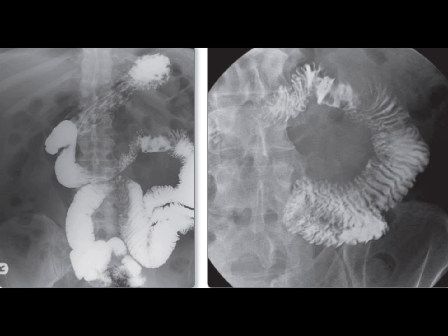The bowel lumen appears to be slightly reduced, but there's no tight stricture, and there's no dilatation of the upstream segments of the duodenum, ruling out obstruction. Even though the lesion appears solitary, I would meticulously examine the rest of the barium follow-through series for any synchronous lesions. It's particularly important to inspect the terminal ileum.